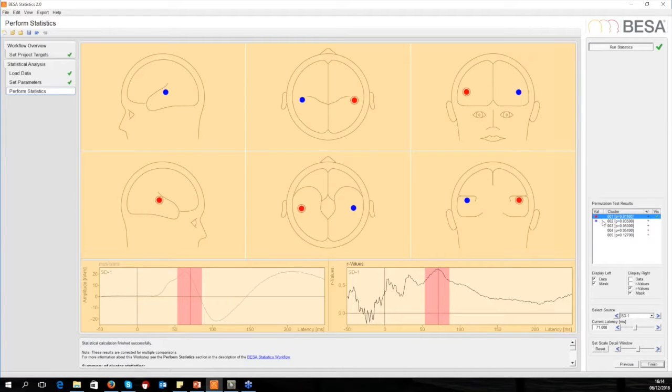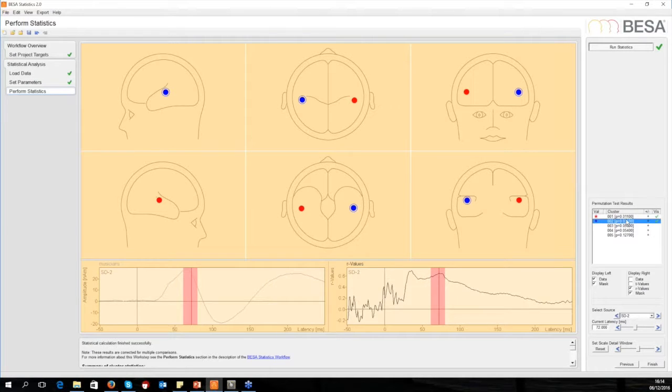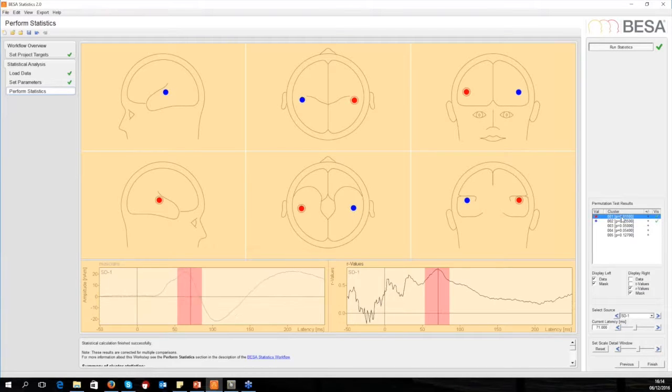The trend is one that didn't quite make it to significance, but is less than a factor of 2 outside of this significance. Remember that because it's a two-sided test, even though p is smaller than 0.05, it's not quite enough here to get us to full significance level. The interesting thing is that the baseline effects are no longer significant.